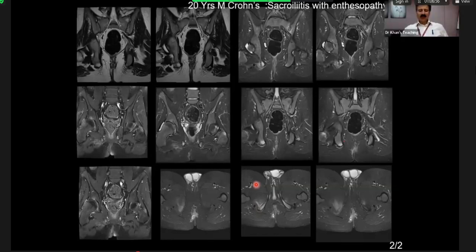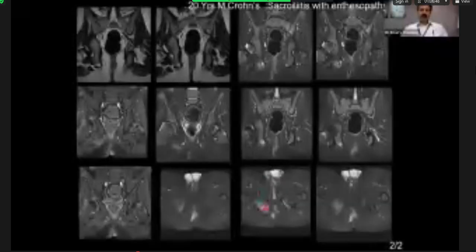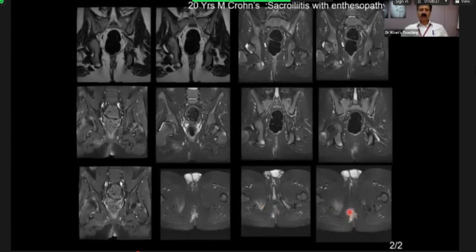No. Okay, I'll take over. The point is that this is classical acute enthesopathy. What is happening is that in this patient, you see there is bone marrow edema, there is also soft tissue edema, and which can happen. So this is why I'm showing it to you. If you look carefully, there is actually a perianal fistula. Perianal fistula is a bit too tough for your FRCR exam. But having said that, you can see this enthesopathy. Look here, ischial tuberosity, and there was edema. What I wanted to show you is that soft tissue edema is acute enthesopathy. Okay, fine.